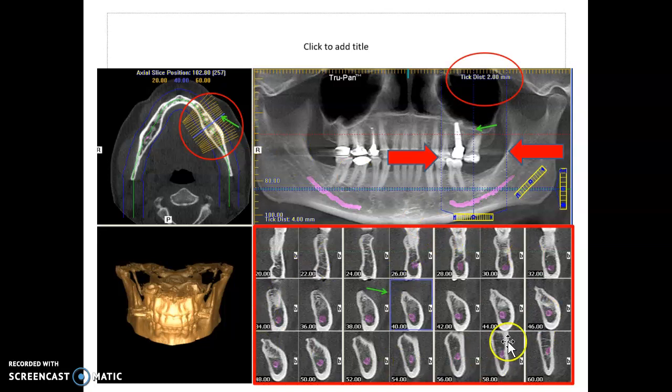Now, this is actually the mandible. So if you're looking at the mandible, you've got 1, 2, 3 images before you start to see the mandibular canal. So in slices 20, 22, 24, and 26 is where you start to see that mandibular canal showing up. Well, if you look here, this slice starts before the mandibular canal on this left side. So slices 1, 2, 3 didn't have any mandibular canal. This is where the mandibular canal first became visible in these vertical slices.